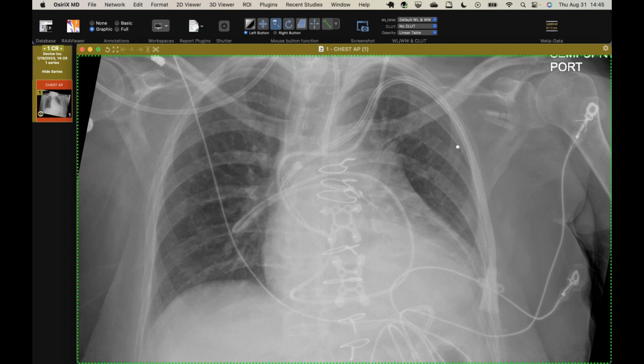That makes more sense, and I wonder if that's why there's a bend in here too, and maybe it was under pressure at the time because they kept trying to feed it. Yeah. And maybe the snag was promoted by an anastomosis between the native and the transplanted pulmonary artery or something like that. Maybe there would be a little bit of a ledge there that it snagged on. That's a great idea. Yeah, that would be right here where the tip is. That makes perfect sense, because these things are pretty stiff. I don't know how they would bend it on itself.